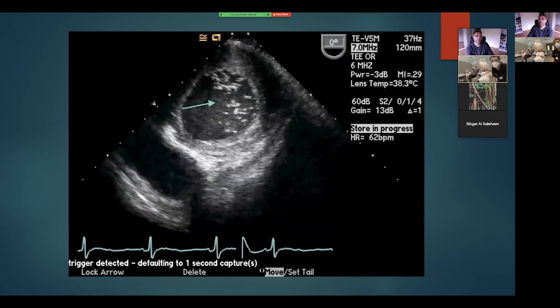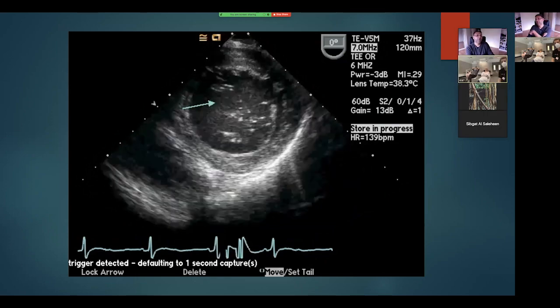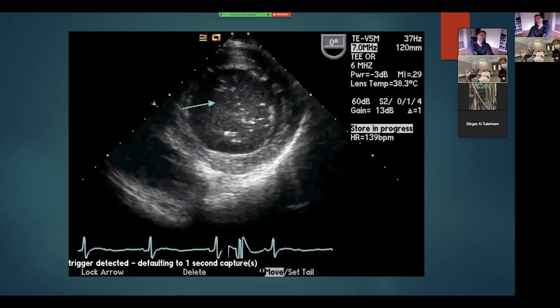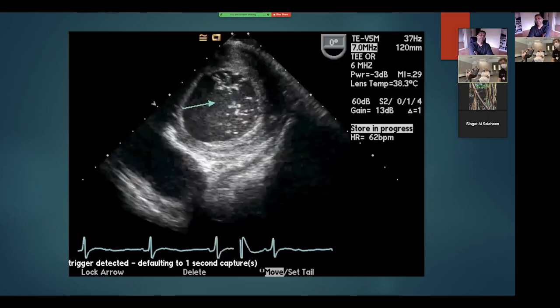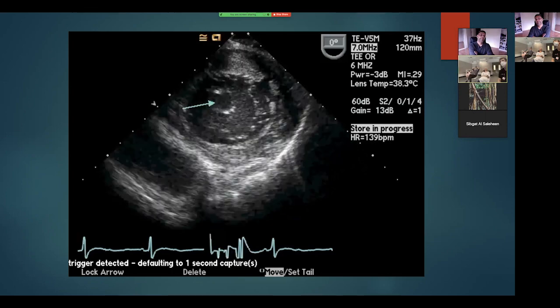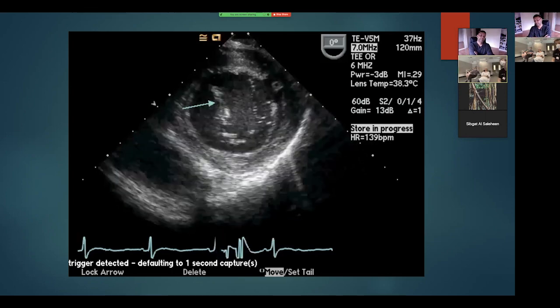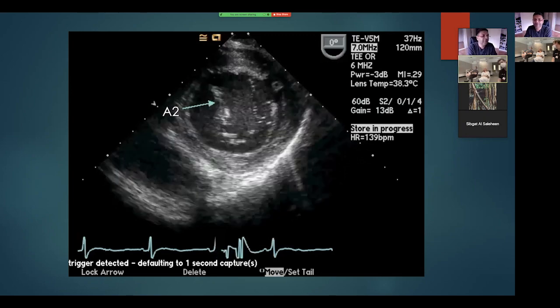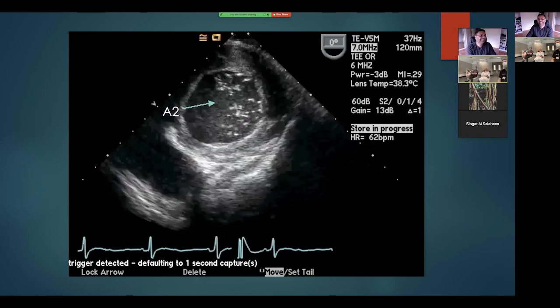And the last one, again, Louis, for you then. All right, that's A2, looks like A2. But I don't know where your arrows are. Yeah, you're correct. It's a bit vague, but it's correct.